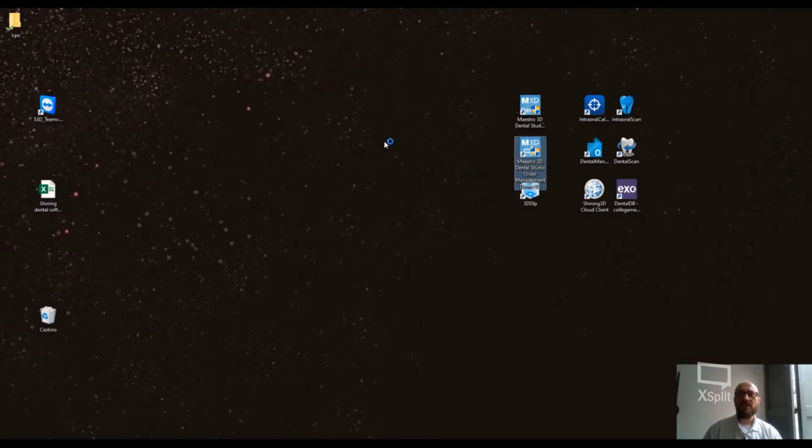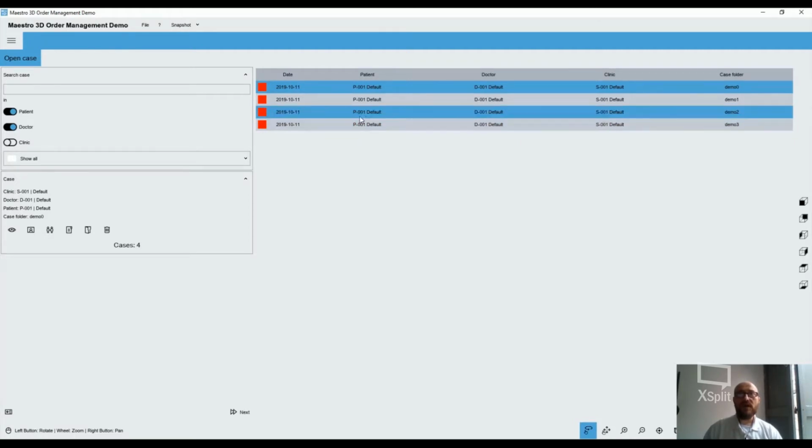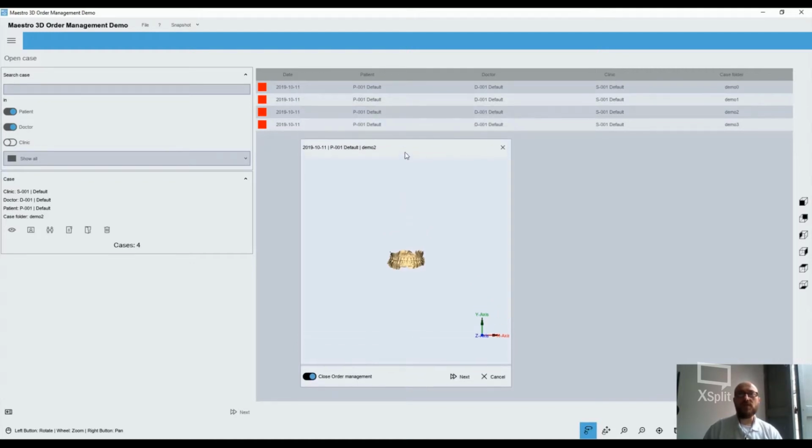I'm opening the Dental Studio management tool. As you can see, I'm working with a demo version, so I have to skip the job definition, the job order process, and also how to import the STL files, but don't mind about it, because as I told you, several video tutorials are available online.